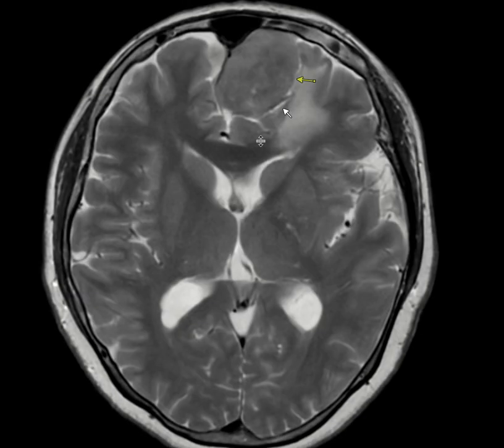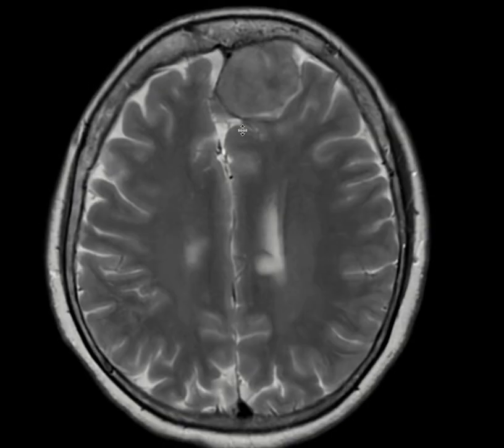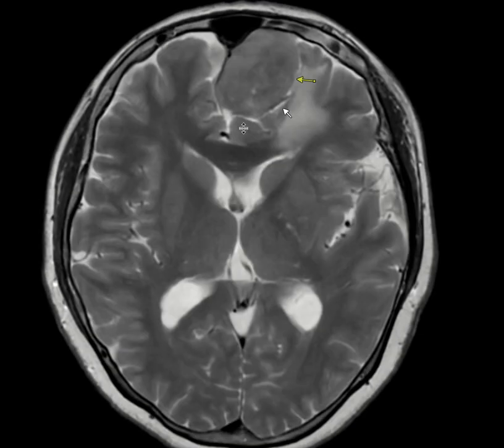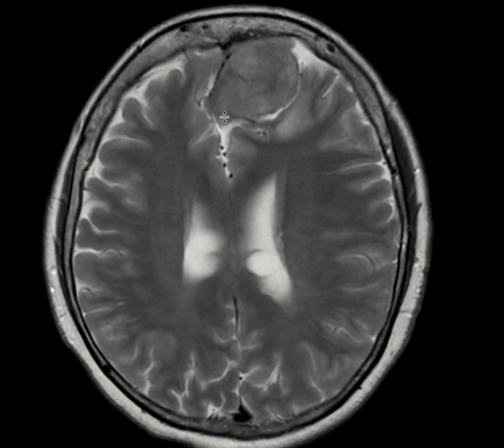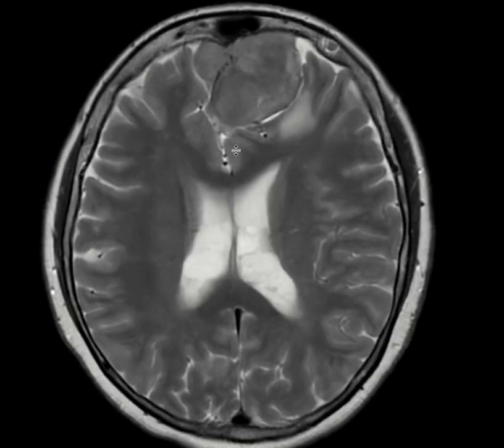It means that this mass is getting separated from the actual brain parenchyma by this CSF cleft. And then you see this area that looks like a cortex to me. The cortex is gray, like here. So these are the cortex that is separated from the mass by this CSF. Basically, between the mass and the white matter there is some cortex left, and the mass is separated by a CSF cleft, and the cortex behind it is getting compressed. There are also some surrounding vessels, as you see here. These vessels are displaced by the mass. They are not going through the mass; in contrast, they are just getting displaced by it.